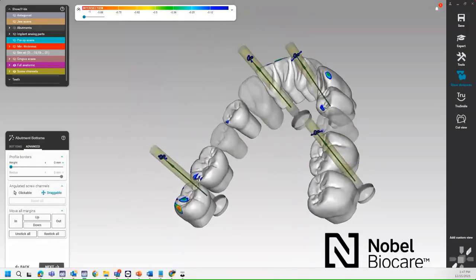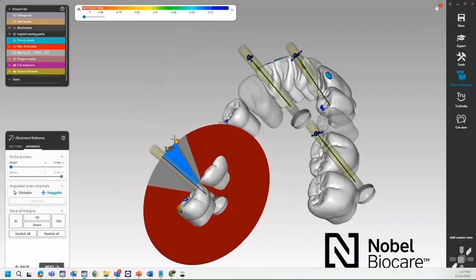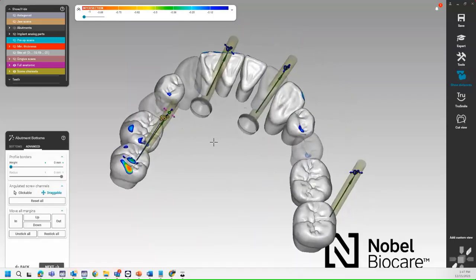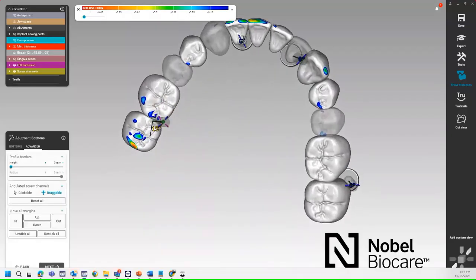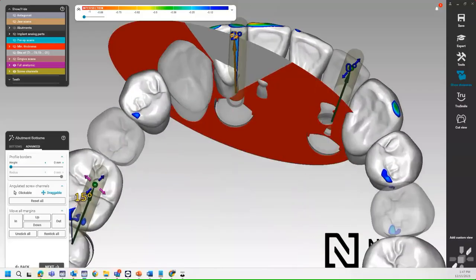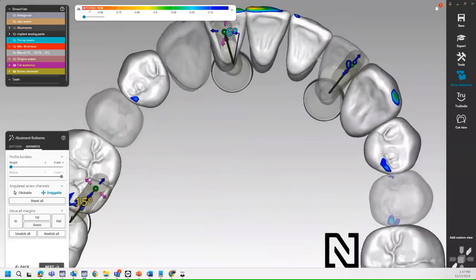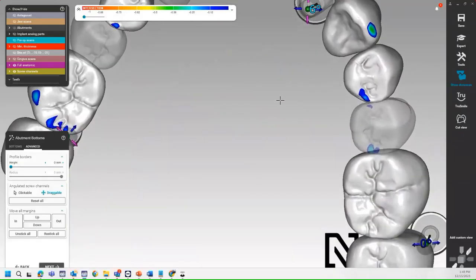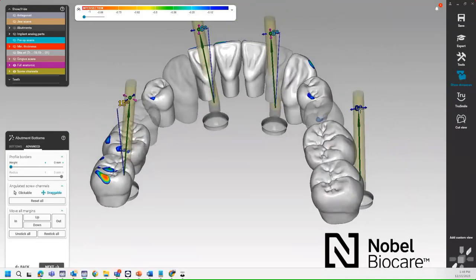And what I'll do is I'm able to change up to 25 degrees of extra angulation. So I can get my cingulums if I want it on the cingulum, if I want to pull this back. And I'm an ASC fanatic. I use ASC on everything.